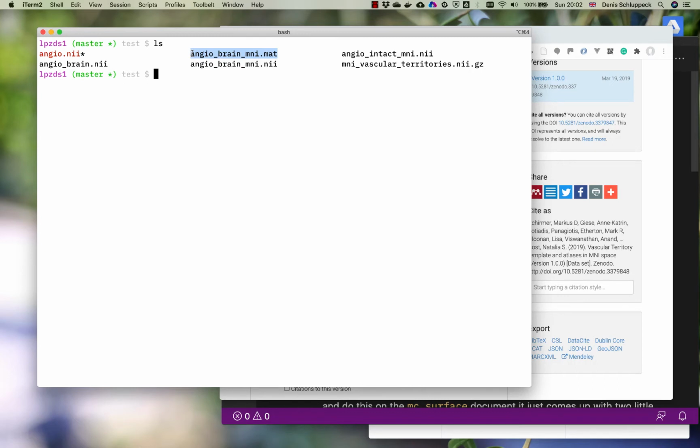And so I want to actually go backwards. So I need to know how do I go from MNI space back into the original space. So what we need to apply is an xform or matrix that's actually the inverse, the backward step from this here. So we need to convert this first. I'm going to first load up the FLIRT GUI.